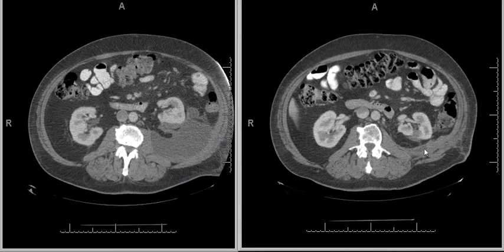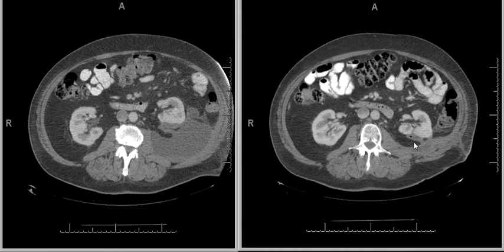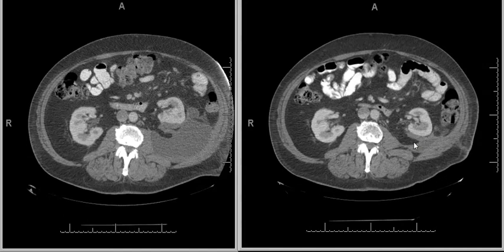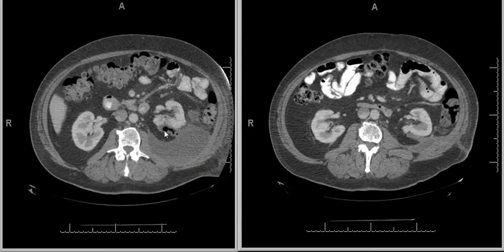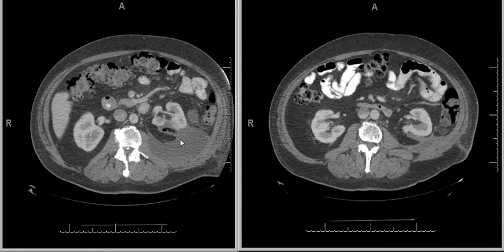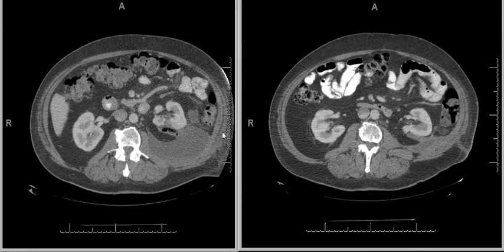And on the subsequent scan, you can see that these have markedly decreased. This is an example of a biologically absorbable hemostatic agent for intraoperative bleeding maintenance. These typically will have a linear arrangement of air bubbles that remain in the same position on subsequent imaging.